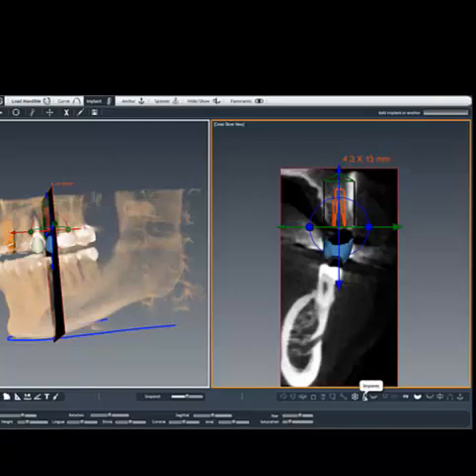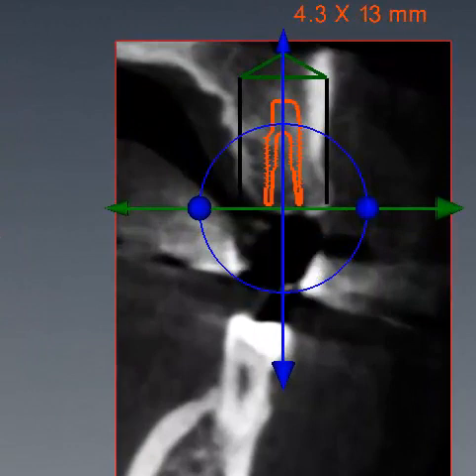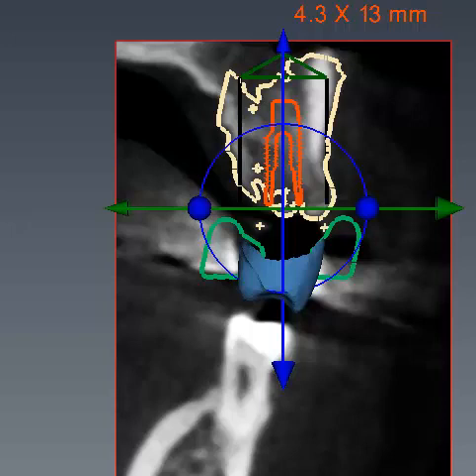And if I put the bone back in again, and the roots and the surgical guide with the teeth, this is the teeth that we reverse engineered, and this is the surgical guide in there, and the surgical guide is going to be snapping onto the actual tissue and bone that is in there. And more importantly, if I were to peel this off again one more time, I'm going to peel off the tissue and peel off the bone.